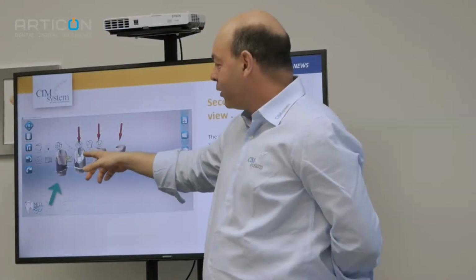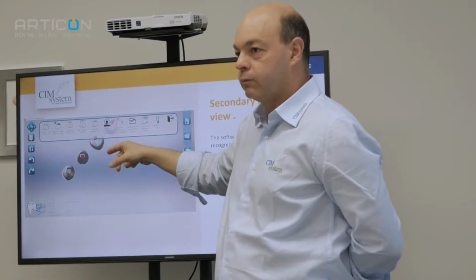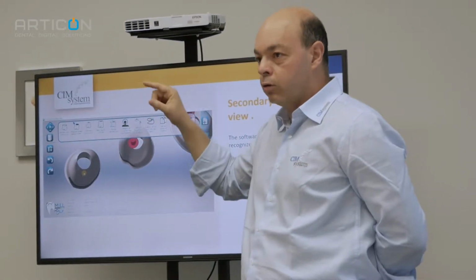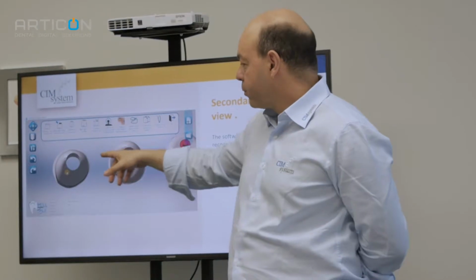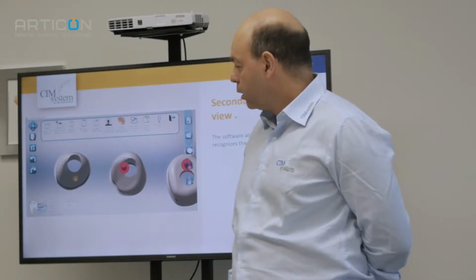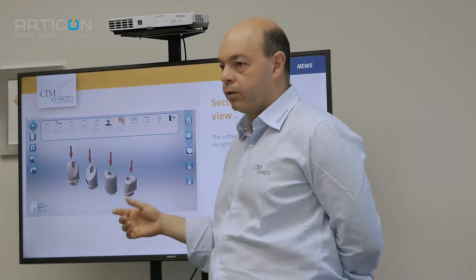For example, it is now possible to find the secondary axis by viewer. Before, to find the secondary axis, I needed to click 2 points, and sometimes people didn't understand where they needed to click. Now I click view, put it in the viewer, 1 click, and automatically Millbox recognizes the secondary axis. It's very easy.